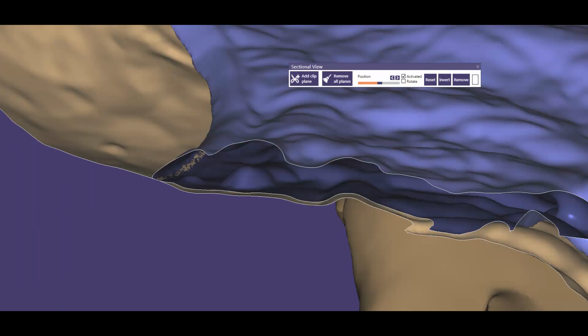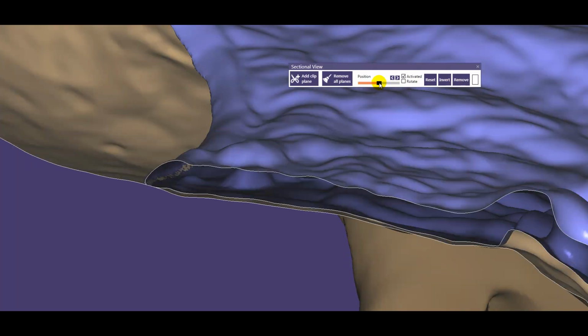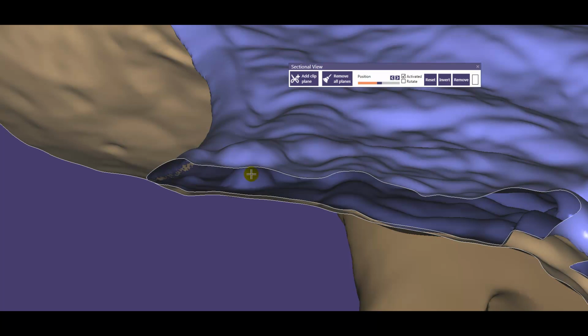Okay, so I have loaded it up here in regular Exocad and sectional view, and you can see here how it's touching or coinciding with the scan mesh, and how there's a nice taper. And if you move this in and out, you can see how that follows. You get this constant ramp here, which is nice and smooth. Also, if you're curious about why this distance isn't static, but it varies, you can check out my previous video that explains the dynamic offset that's being added.